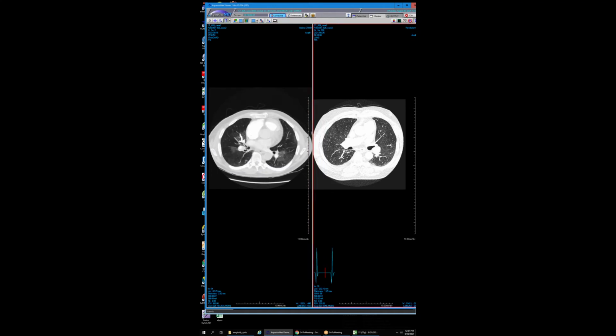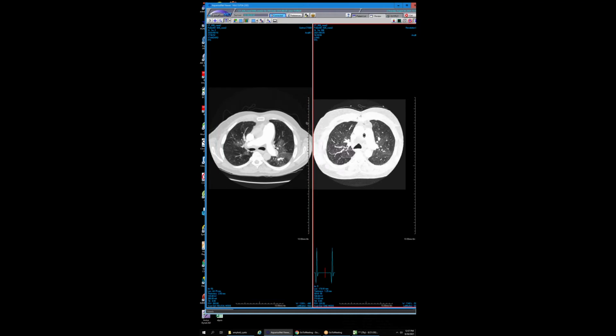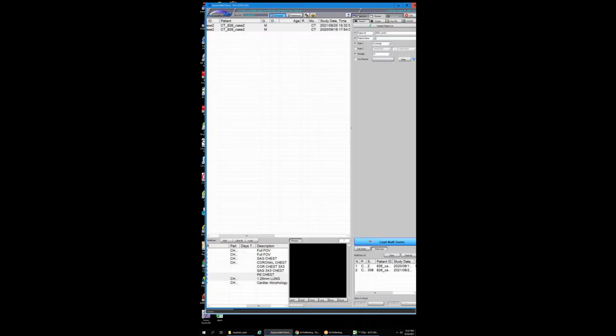Unfortunately, most of the scans that we acquire post-op are within a few days or so post-op. And the perfusion changes are really still there immediately post-op. The areas of hyperperfusion are still there, but a year out, I guess, those start to change as the distribution of blood flow becomes more homogeneous with the opening of the obstructions. I just thought that was really pretty. I had not seen that before. I mean, again, this vessel is this area here. Anyways, I thought that was cool.